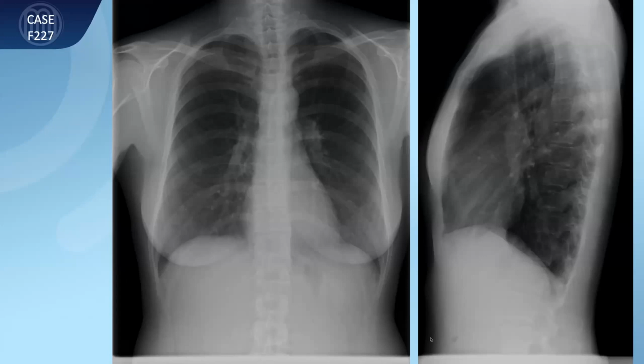because this is what I call a bias. If I tell you that I will show you a case with a fibrosing lung disease, and I show you an image, you will say, okay, there's something going on. But if you show this to a radiologist, I'm very sure that most, if not all, of the radiologists will tell you there's nothing going on. It's a completely normal chest radiograph. You see an increase in density from the top to the bottom on the chest radiograph, but this is primarily due to absorption by the breast tissue. If you look at the lateral, you see there's nothing going on here. This is normal.